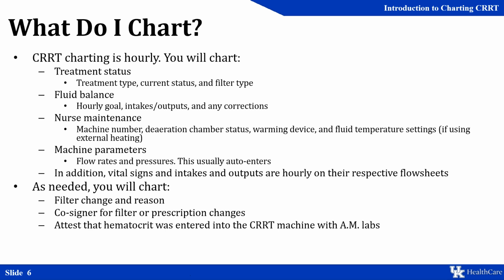As needed, you'll chart your filter change and reason, and any time that you change a filter or prescription, you should get a cosigner. This is also required by policy. In addition, there are a few small attestations, such as that the hematocrit was entered into the CRRT machine daily, as well as the daily weight.